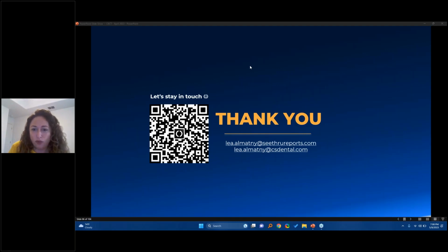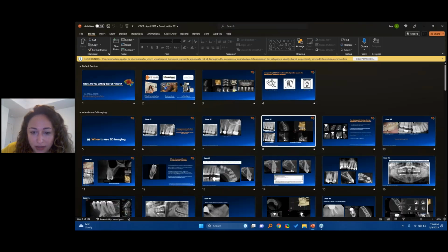I think Lenovo is a robust laptop, and it's the same one that comes with the Carestream machines. I don't have the specs top of mind, but if you email me, I can send you what's needed. Can you show how to arrange lines for a specific tooth? Yes, sure, let's do that.